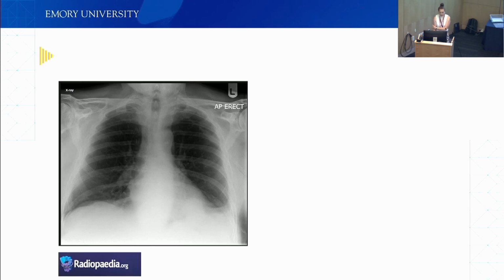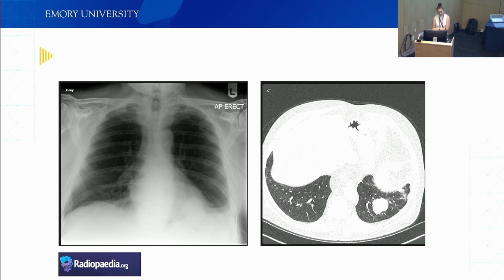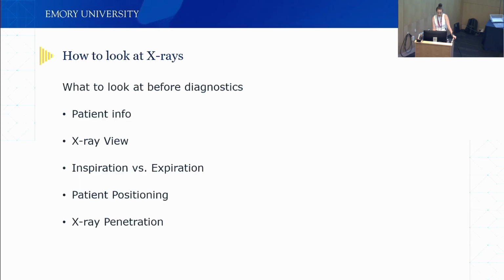So this is a case where we have an x-ray. And there is an abnormality on this X-ray. It's way better visualized on this CT. So here you can see this mass here. It's behind the heart. It's sometimes easy to see. It's very easy to see on CT. So sometimes you want to combine these two image modalities or use CT as the label, depending on what you have present of these patients.